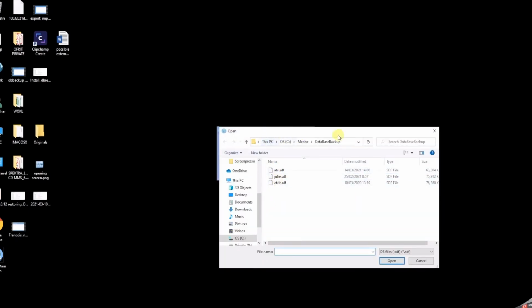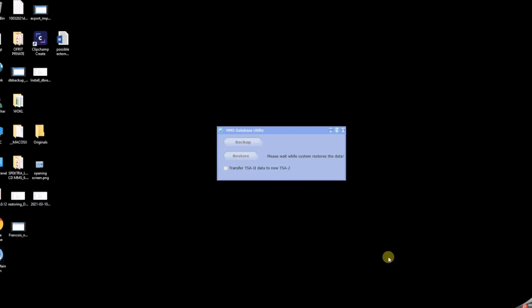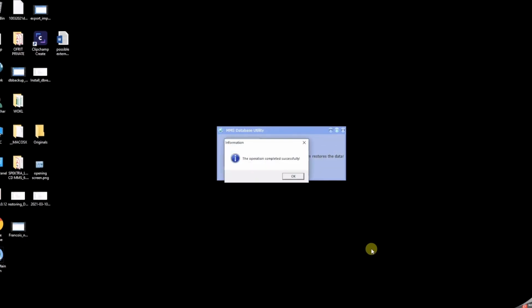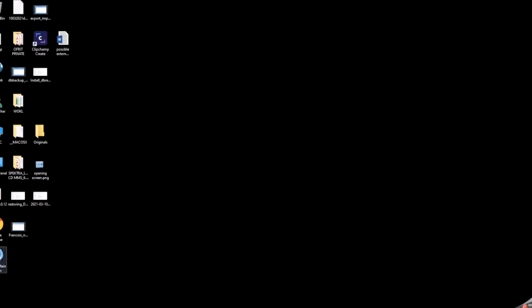It will go to the standard file format, but remember, I saved this on my desktop. So let's go to my desktop and let's choose the file that I saved. This may take a while. We'll wait for a confirmation. Okay, so this is the confirmation. Let's close this up. Go back into the software.